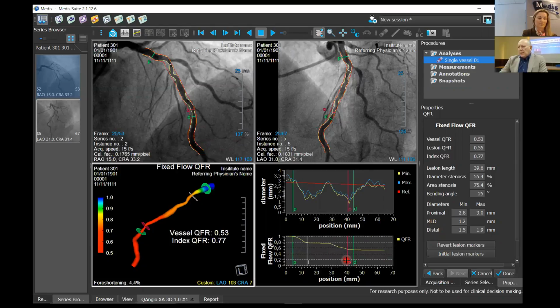So in this case, you have 39.6 millimeters of stenting, and you are sure that you will cover all the functional drops of pressure in the coronary artery. This is another use of the virtual pullback curve, maybe about 40 millimeters. We found the tool is very precise.